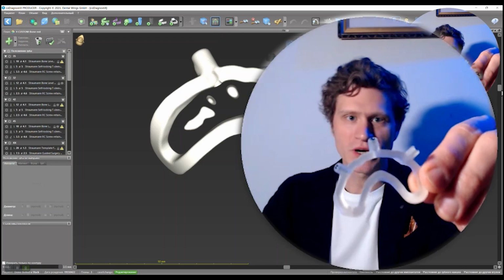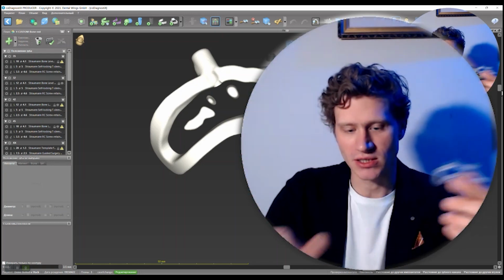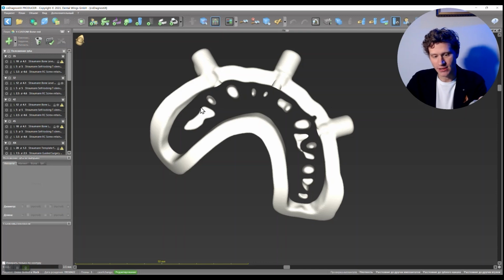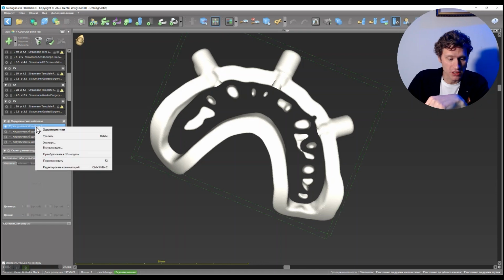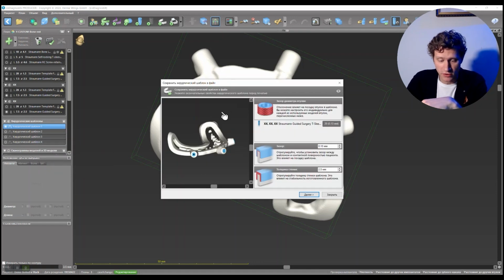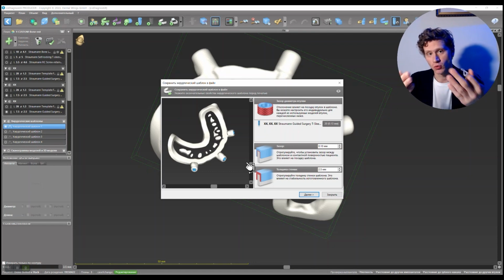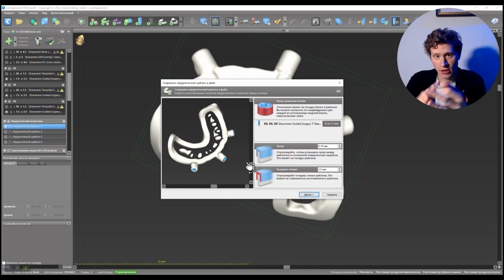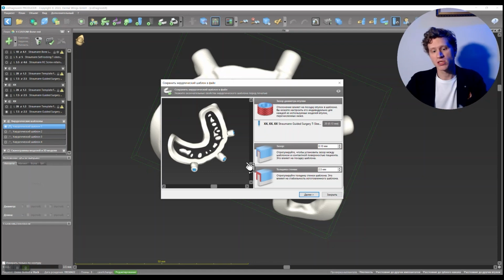The most attentive may have noticed that there are no artifacts in my surgical guide, and here, on the screen, there are. It's a lot of different elements not attached to the guide that I need to remove. And if I unload this particular guide and click export, it will unload with these artifacts. And then I will have to remove these artifacts in the 3D printer program. But not all programs have this function. And we can do it in another way.